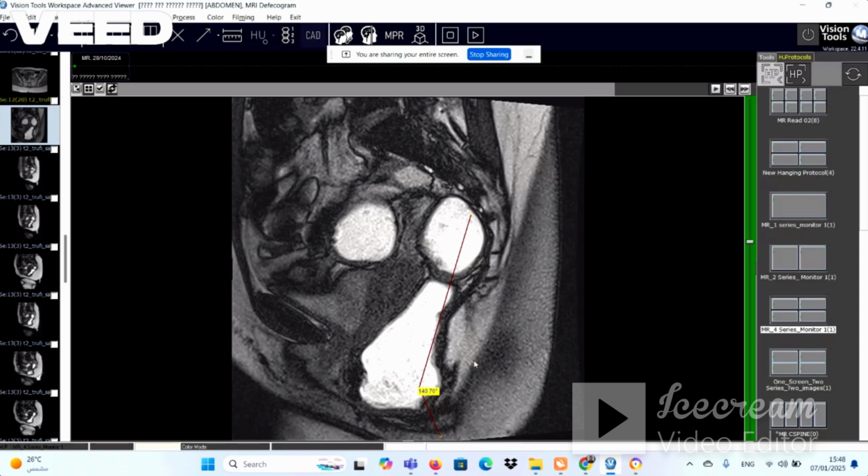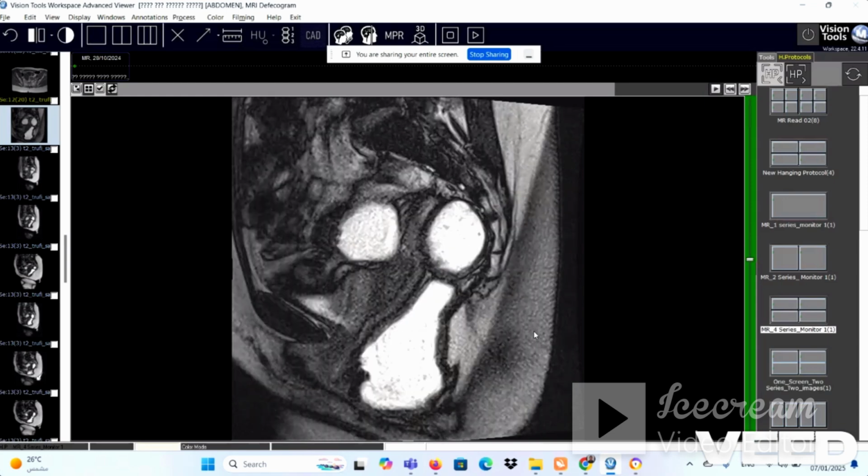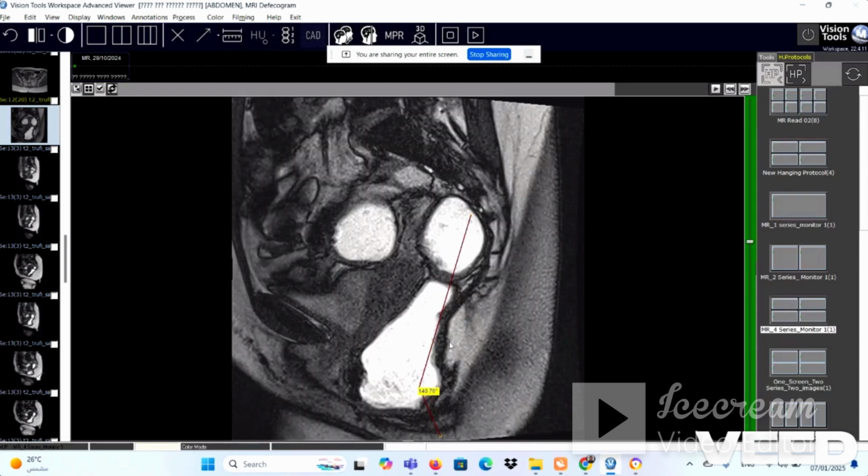We don't have any spastic or paradoxical muscle contractions for the puborectalis muscle. The angle is accepted to be increased between the resting and the straining. But we have here significant descent of the anorectal junction.